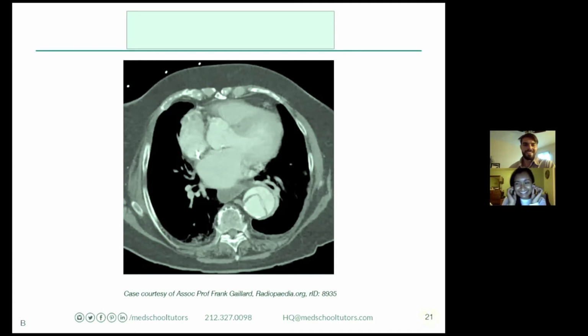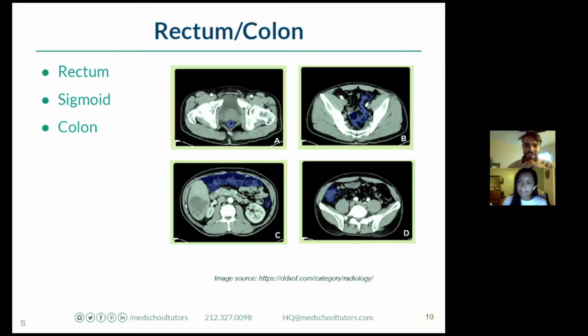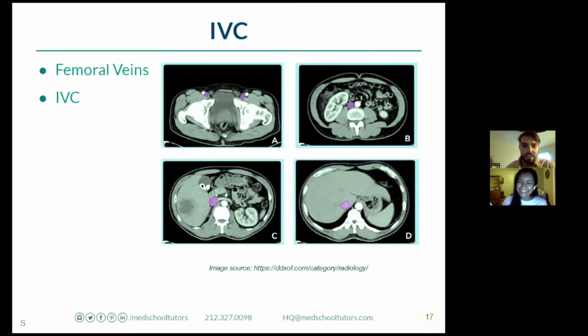Blake. All right. Yeah, one thing I just wanted to mention on some of the slides that you just went through. Oh, of course. I just wanted to say that as you were tracking some of those vessels, one thing that you can use, again, as a little trick from a non-radiologist here, is when you're tracking the vessels, to see how, it's hard to see actually in this slide because it's purple, but go to the next one.